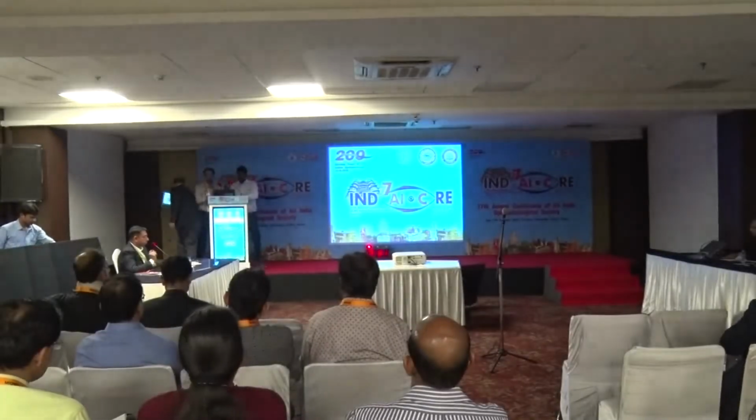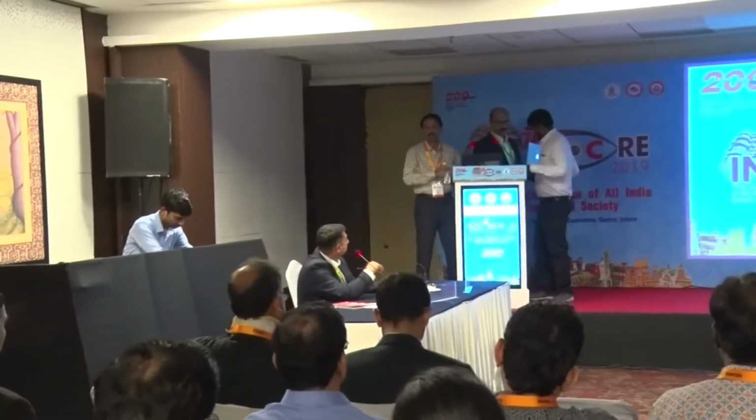Okay, and I just want to ask you one thing. What is your opinion if I say that multicolor imaging is a wonderful macular screening tool rather than a prognostic one? As I had shown, it could help you suspect a lot of pathologies that you would normally not pick up, especially interface disorders and even choroidal disorders. So it's a wonderful screening tool to pick up a lot of macular disorders which could otherwise be easily missed.